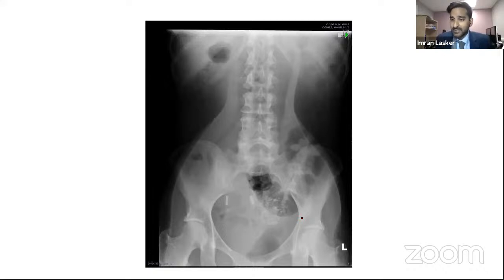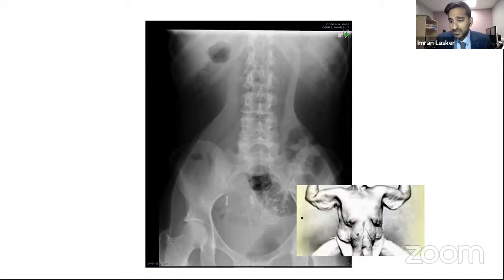But try and remember, we're looking at 3D structures of 3D people. These are 3D people, right? So we're looking at 2D pictures of 3D people. What else could it be? Skin folds. That's all it is. There's just skin folds. But you can get confused, you start to panic because you think, okay, what on earth is that? But to go back to basic principles, what anatomical structure can go from inside the body to outside the body? Not very many things, but skin fold can. It can look like that, but it doesn't.